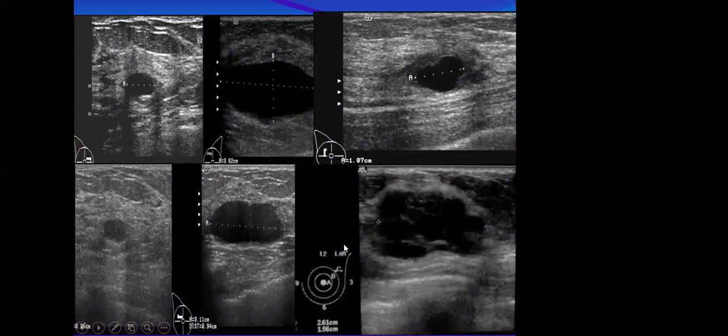I think fibrocystic breast until there is a lesion. I'm giving you multiple lesions. Give me BIRADS for these lesions. So the first ones, the upper ones, are simple, but the lower ones, especially the last one, is it right or left? Lower right or left or central or middle?